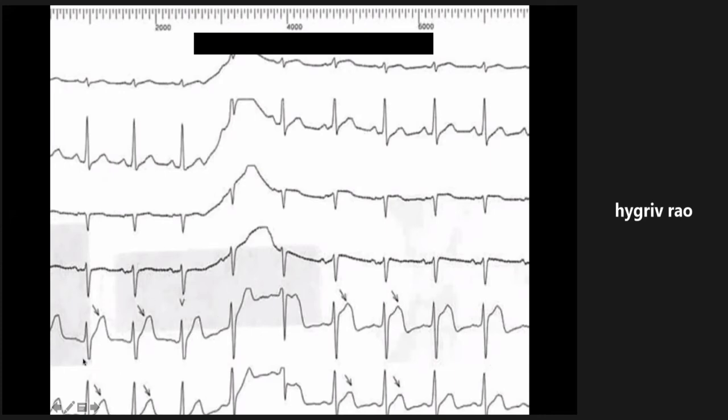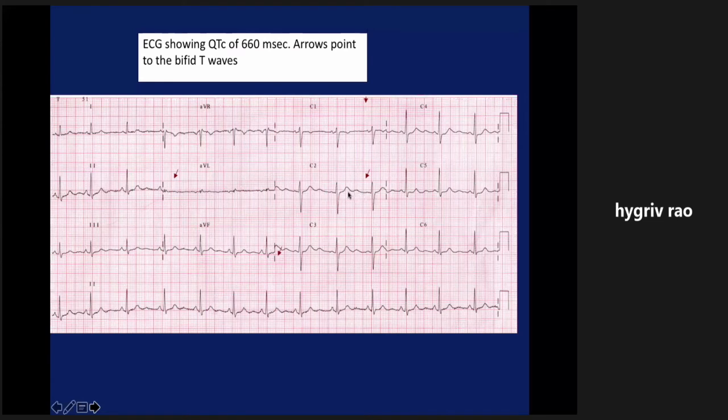If you have a VT in a person, you can see there is an ST elevation. This is a young man with an ST elevation who doesn't have chest pain or anything. This ECG is always like that. This is one of those repolarization syndromes, one of those congenital syndromes of sudden death called Brugada syndrome. Similarly, if you have double T waves or things like that, and a VF or VT, look at the QT, so long. So never miss, in sinus rhythm, look at the QT for a patient with a wide QRS. Always, for a few reasons.